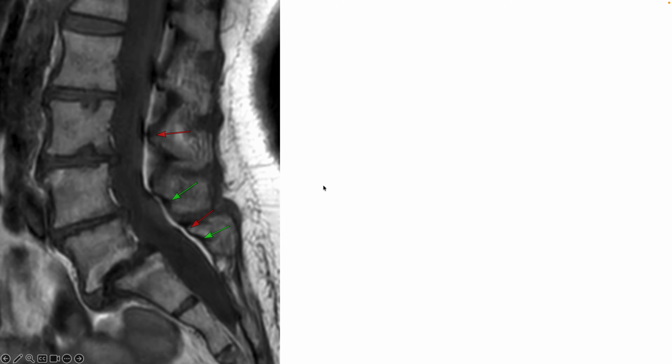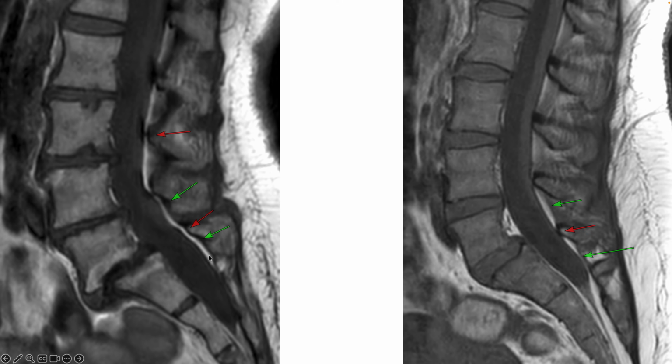The last one is not always seen, but when seen, it's a very interesting sign, and that is the epidural interposition fat sign. So normally, when you look at the epidural fat, it gets interrupted. It's not a continuous line, but at the level of the spinous process, the dura is attached to the spinous process, and the epidural fat posteriorly gets interrupted. Whereas because of, again, the posterior movement of the spinous process and the posterior elements because of the lysis, eventually that tethering is gone and you find a continuous column of posterior epidural fat. But it's not always seen.